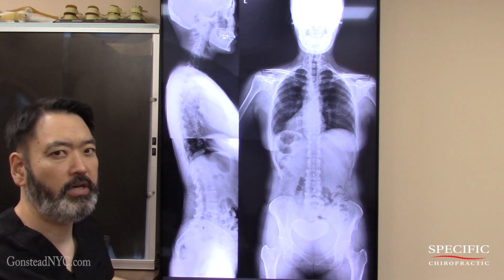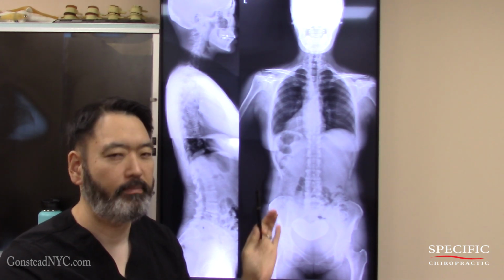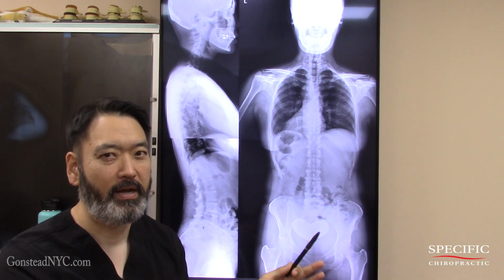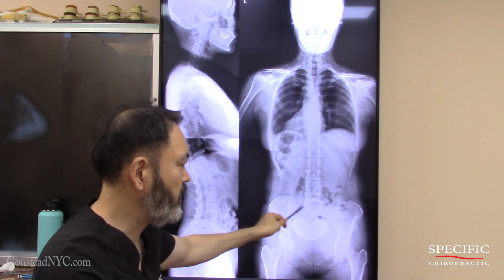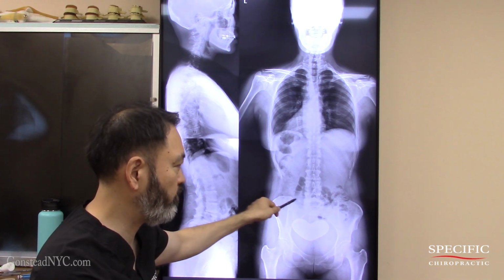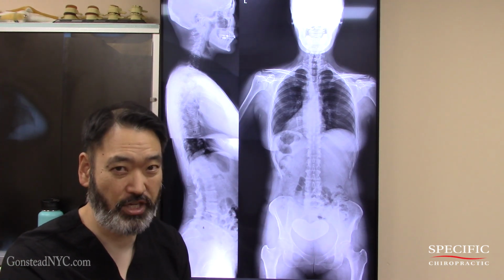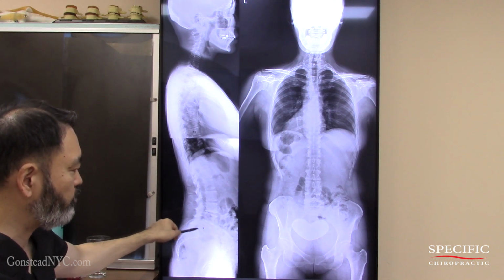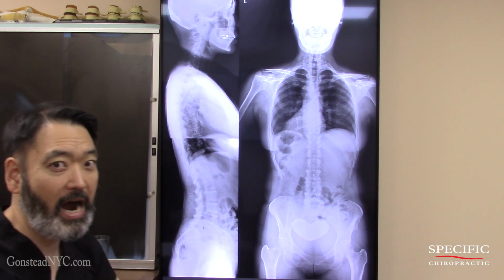So the next follow-up is, okay, are we dealing with an actual normal sixth lumbar vertebra, or one behaving like a fifth lumbar vertebra, or is it altered and deformed in some way? So we took a look at the AP, and it seems to be fine. The transverse process has a complete space, no joint over here. It's not touching the ilium, not touching the sacrum, which would mean sacralization, and we don't want to have that. Same thing over here. The sixth lumbar has a full disc, and it's not trying to become part of the sacrum either.